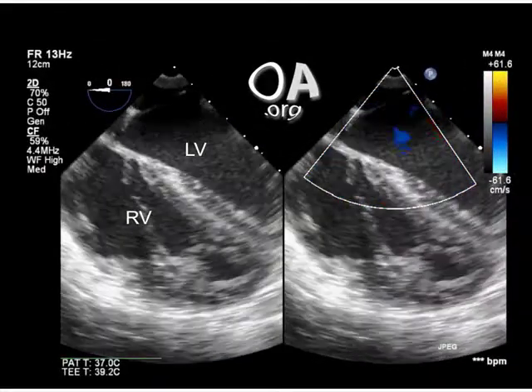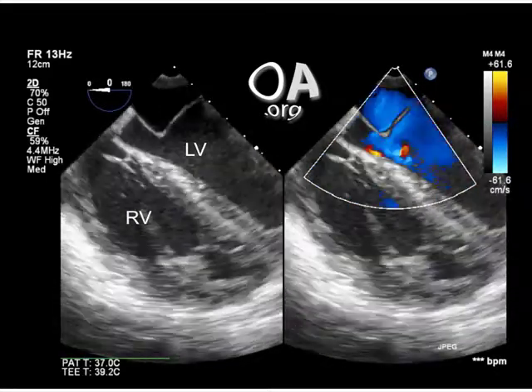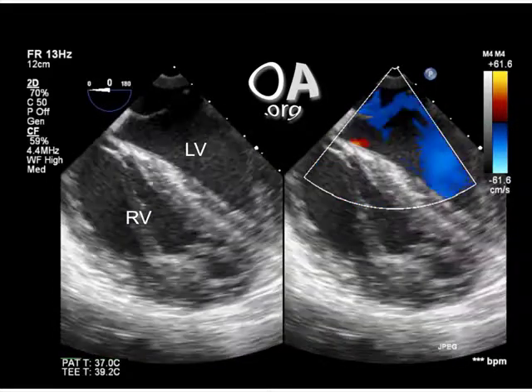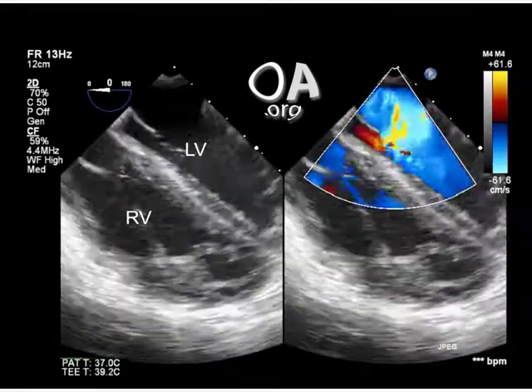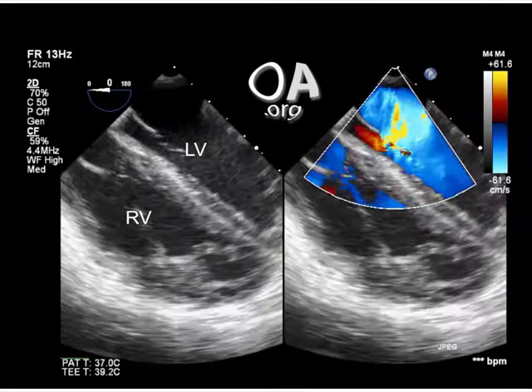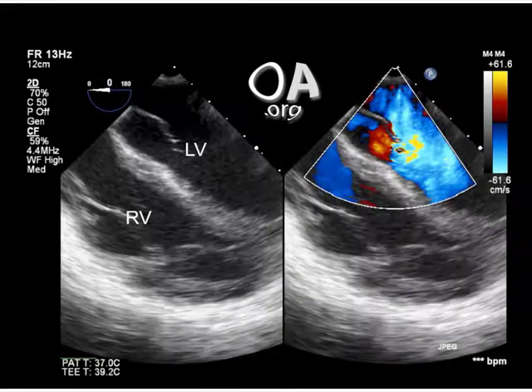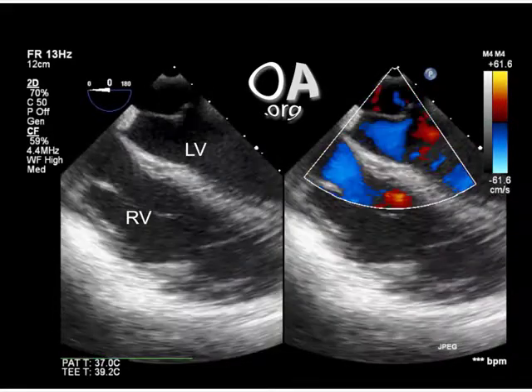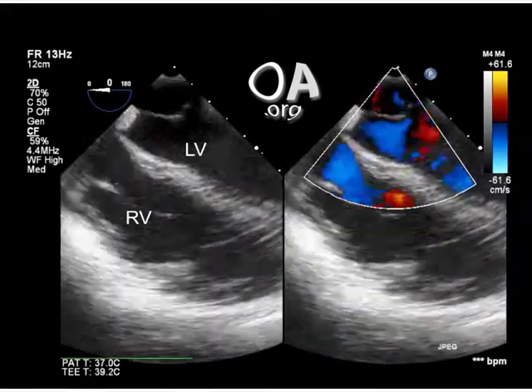These are side-by-side images of our patient's right and left ventricles as labeled. This is a 4-chamber view at 0 degrees, although both atria are not completely imaged. Even though both ventricles are not shown in their entirety, it is important to notice that her right ventricle is dilated and hypertrophied or thickened and makes up part of the ventricular apex. Normally, the right ventricle is ellipsoid or crescentic in shape, making up only 2/3 the length of the left ventricle.